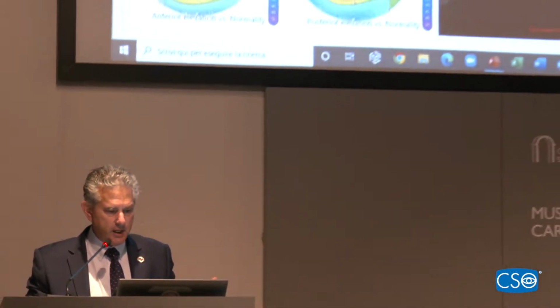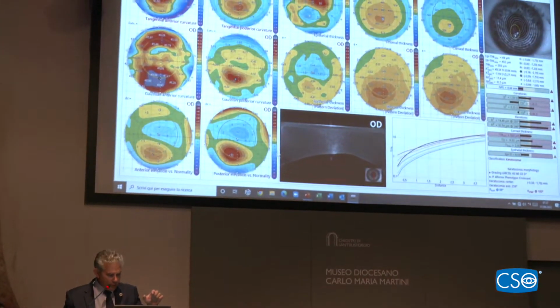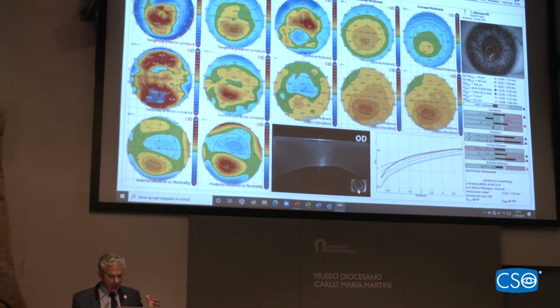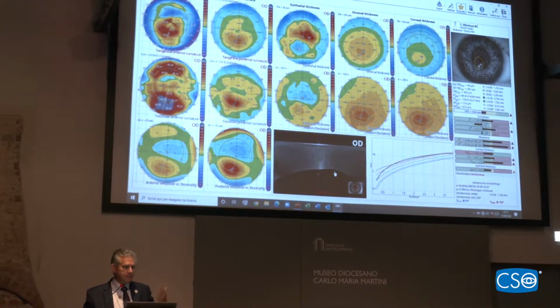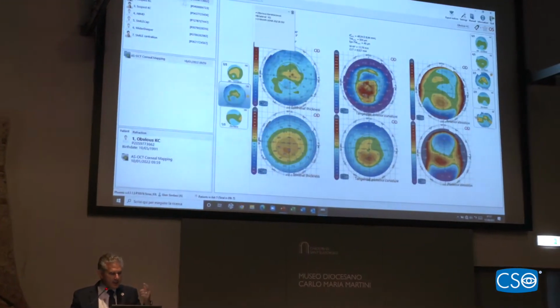So this is an example of an obvious keratoconus, because obviously the other eye, like I showed you, has much more obvious epithelial thinning over the cone. It's completely obvious, and when you look at this pattern, you look at the anamorphic display, I mean, right? It's obvious. So, okay, let's look at case number 2.